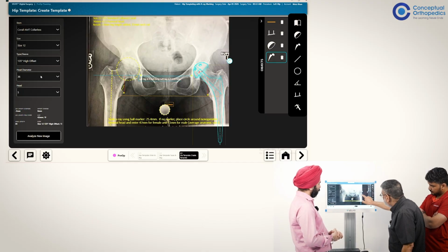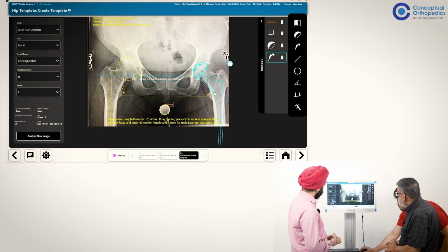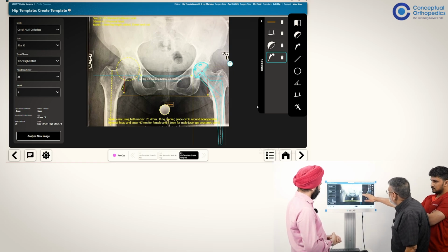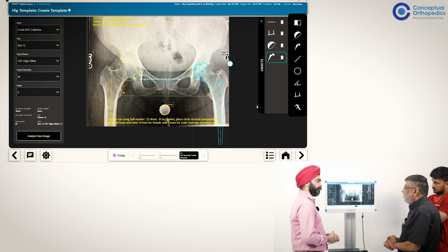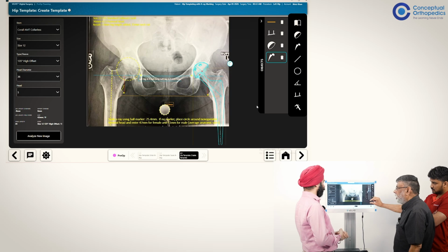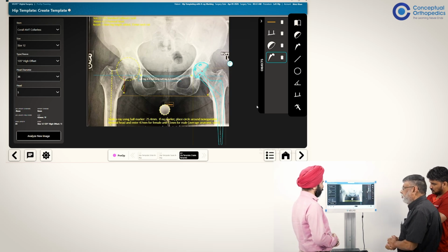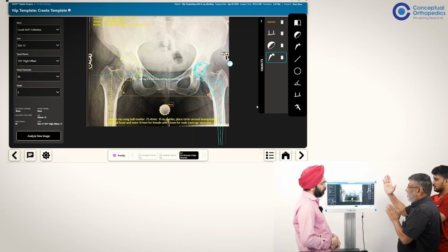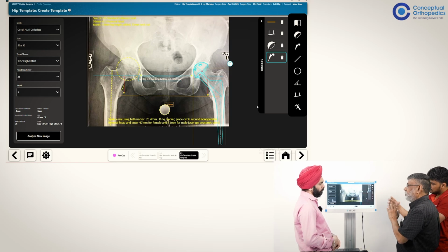So let's say this is coming here, and we cut it low. So sink this down. If you sink it down, then what happens is the offset is increased, but shortening also will happen. Then once you cut it lower down in a very varus hip, what you do is you build it up with the length. You vertically brought it down, and then when you build it out with length, your offset will also increase.